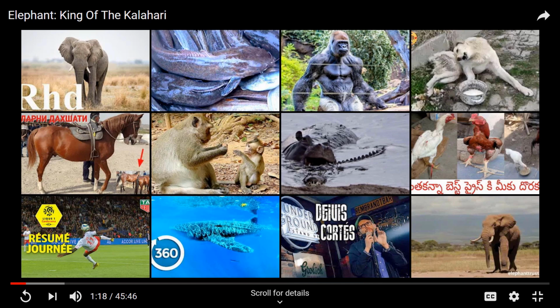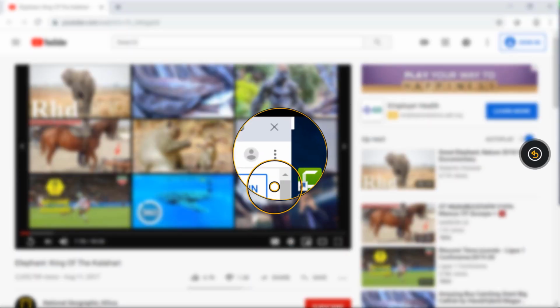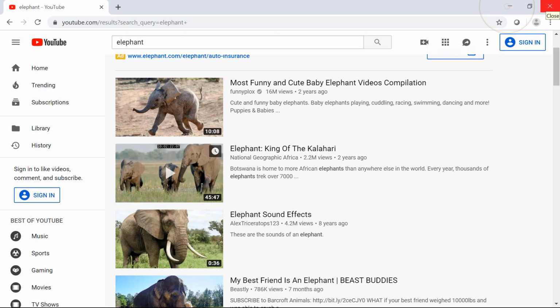After enjoying the video, Emma exits the full screen mode and then tries to close the window. As Emma is having trouble precisely gazing on the close button, the Adjust Target function comes to her rescue. Adjust Target fine-tunes Emma's initial gaze trace fixation point to the precise location of the close button, so that Emma closes the window easily and goes back to the video list.